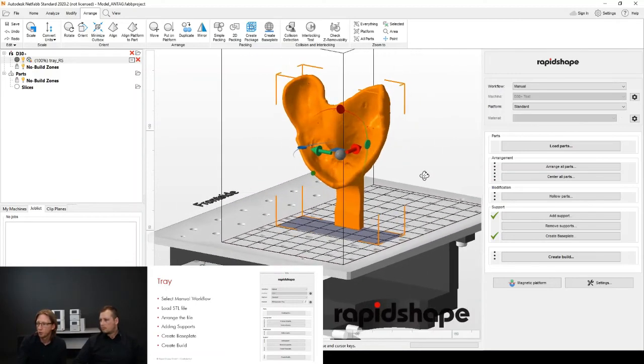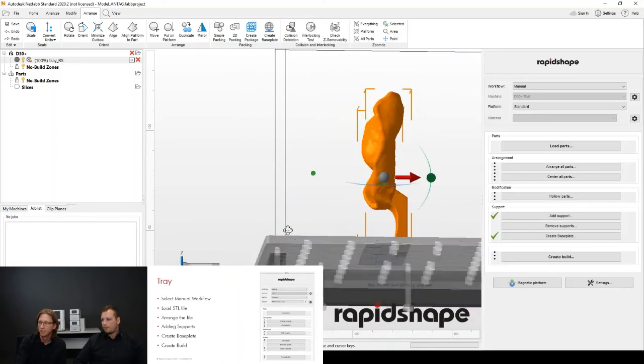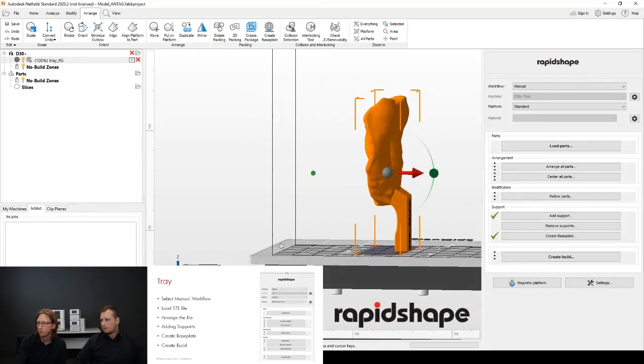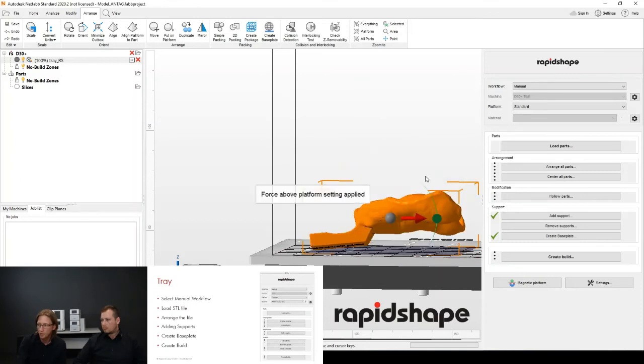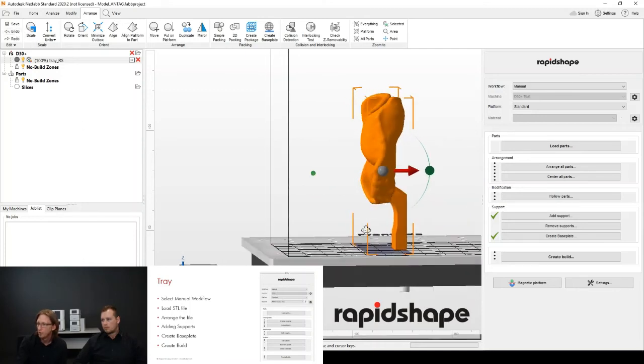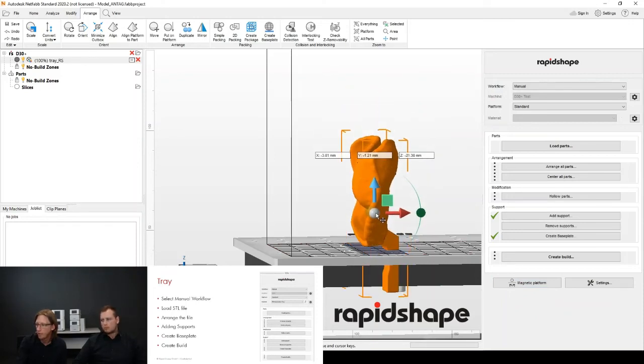So I think the crucial area is the palatinal area, what we are looking at the moment. In this case, I would say either you put it horizontal for a quick print result, or you just, let me check, I have to go back with undo. What you can do is put it down in a way that you have created a gap. So let's say you put it up vertical like this. Again, we assume that there is no handle there.